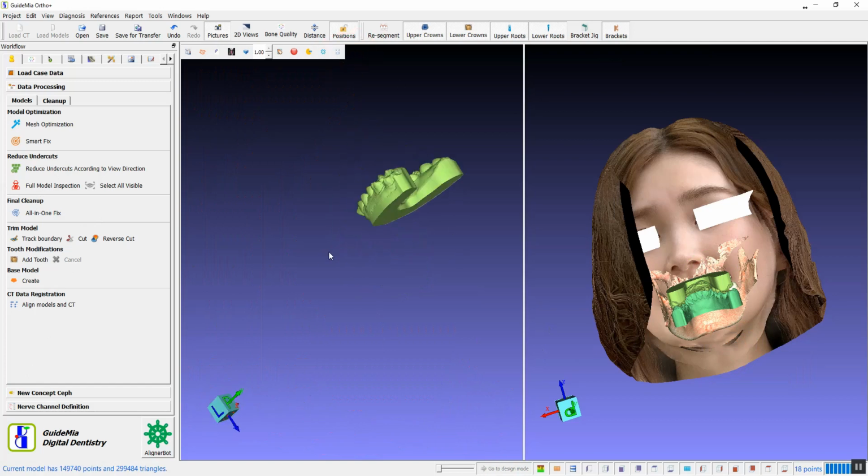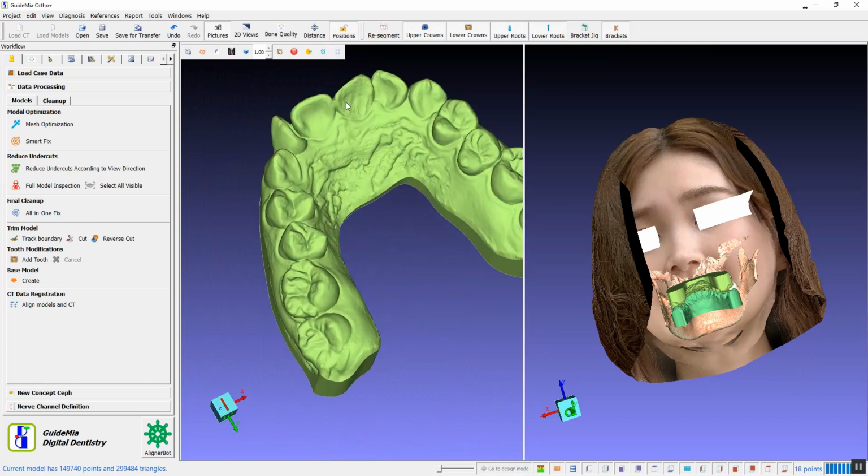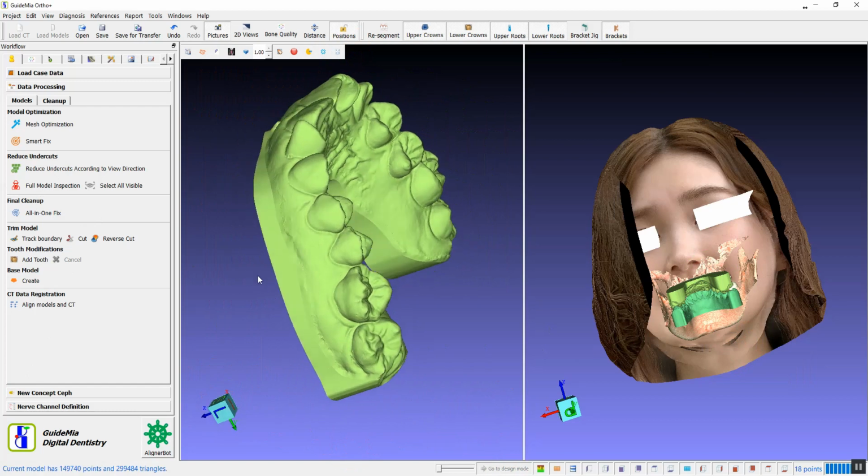Both scans have been processed and are closed solid models. Unfortunately, the files have various quality issues, which we will show later. We will perform automatic fixing operations over the scans, but it is desired to have open shells instead of solid models. On the other hand, very often we receive open shells, and want to trim and close them.